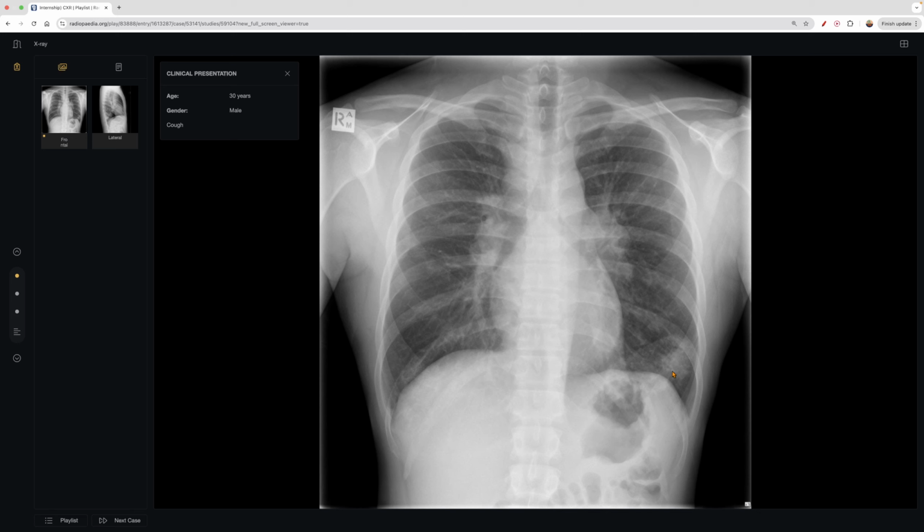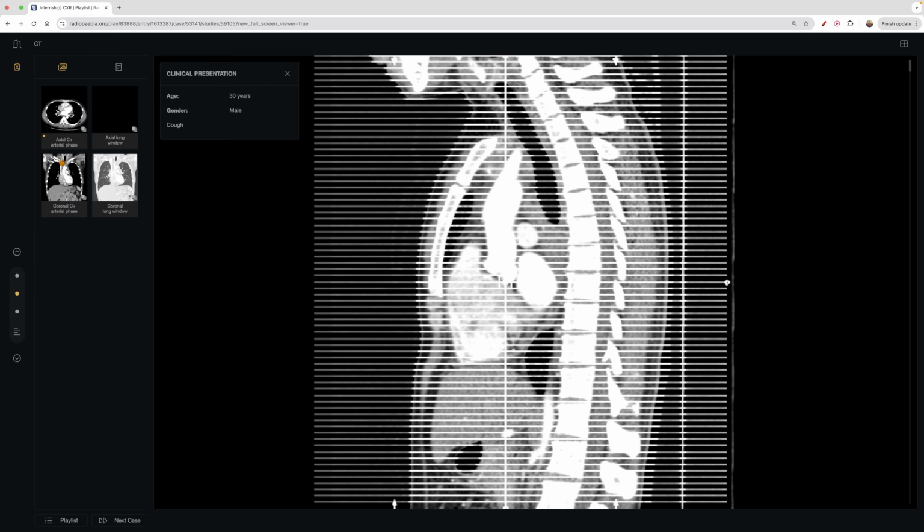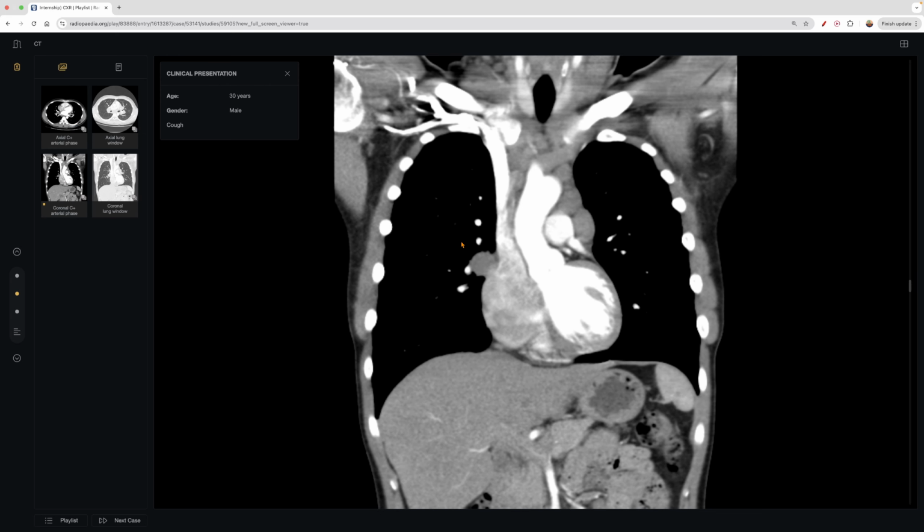And this opacity, this is one way that sarcoid can present. It can present pretty weird with how it looks on the chest radiograph, but nonetheless, you rely on the adenopathy and then some more clinical history. And I think some of these images, you can appreciate those lymph nodes, right? And so that's what lives in that area.